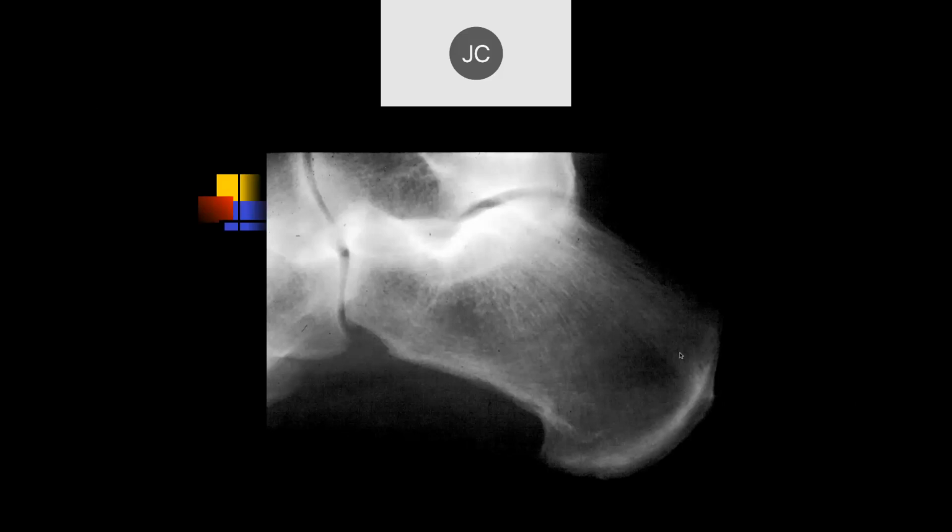Okay, so let's see. Robert, this is a patient who has heel pain. What do you think of the x-ray? This is the symptomatic side. On the X-ray, I don't see a whole lot abnormal. I agree with you there.